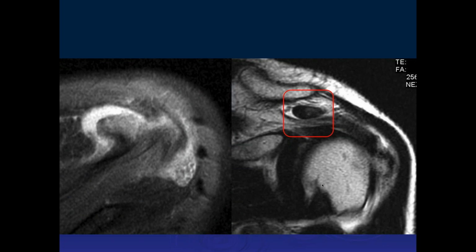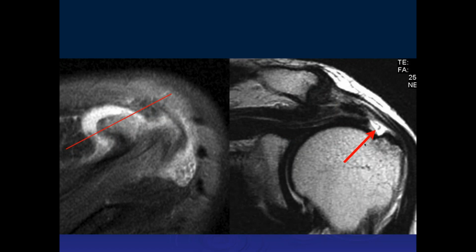Axial image. So again, shows fluid, and I think we can see it with a little more intensity, hyperintensity, that focus there. Yeah, right there, so anteriorly. The plane is right through here. So what is all this stuff? I wonder if it could be part of the tendon, that it's kind of bended or retracted, and so the tendon is torn here.